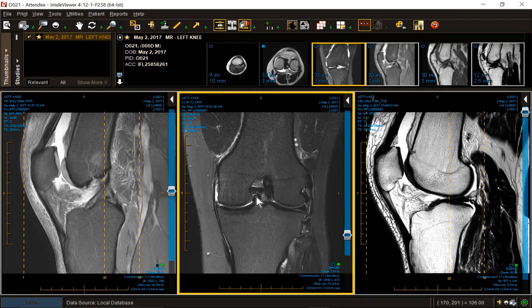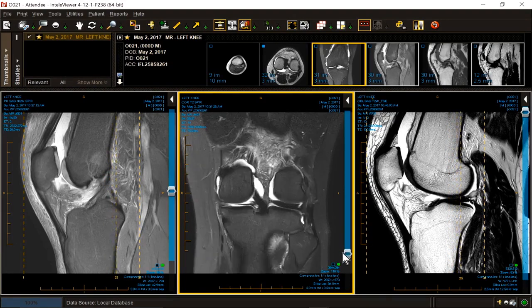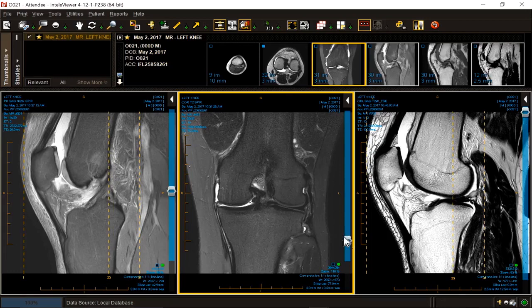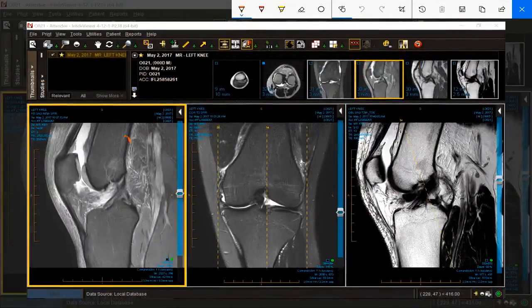That's not an accessory bundle or an anterior insertion of the broad PCL footprint, a common pitfall. It's a piece of meniscus. And how do we know? Let's scroll. Let's roll. There's hardly any meniscus in the back because it got ripped off. And we come forward, and we know that there is a piece here, and it could be that we just have a curved meniscus. It could be that the meniscus is just curved like this, and we volume averaged.